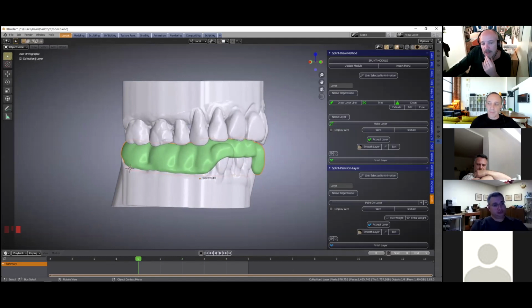Yeah, and you don't want to have a patient coming back to you and saying, oh, my splint keeps falling out. Because you can always take away, but you can't add, you know. So I would always think, engage the undercuts that you've got, especially in young people. Some youngsters don't have any undercuts.